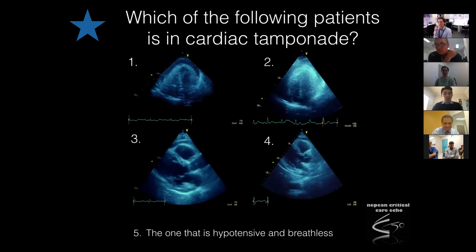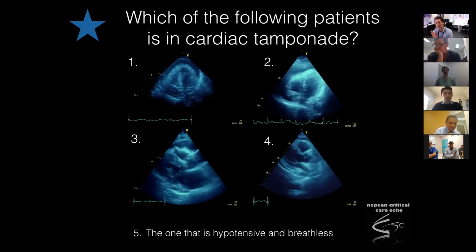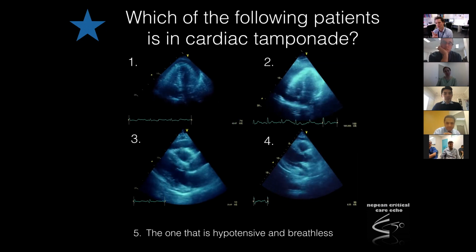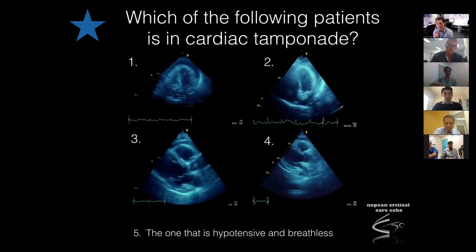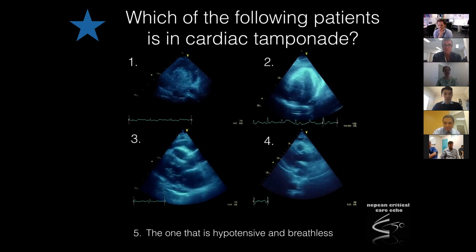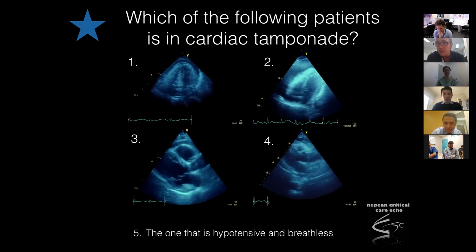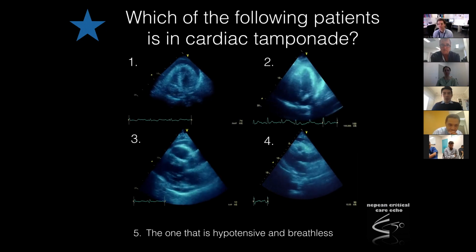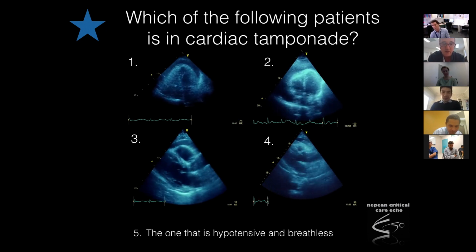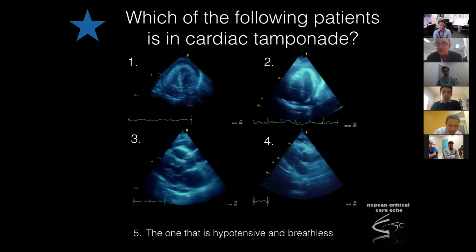Carton, give me sizing. I just talked about these being mild, moderate, and severe pericardial effusions. Carton, how do you measure pericardial effusions so that you could put them into which category? Well, first of all we would describe the presence of it, whether it's circumferential or localized, whether it is present throughout the cardiac cycle or just present in systole.